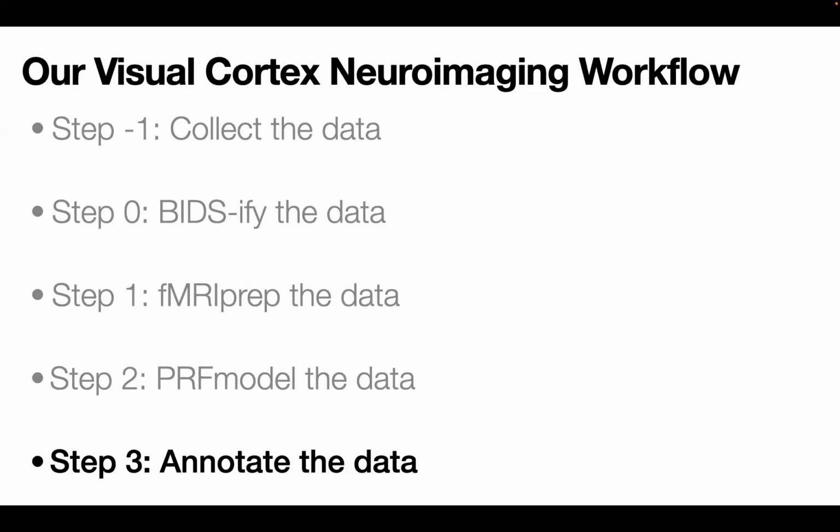It's intended to be a very flexible tool. We wrote it because we were trying to collect lots of annotations from lots of people, and then compare them to see how they compared across raters. So it's made so that you have other people go check out a GitHub repository, run something, and then upload their annotations to GitHub. It can also be run in a much simpler way, which is what we're going to do today.